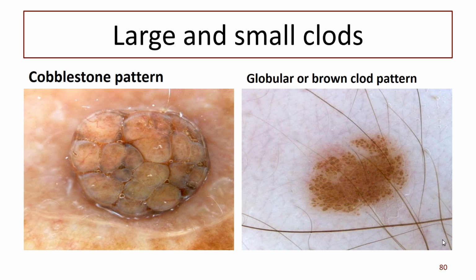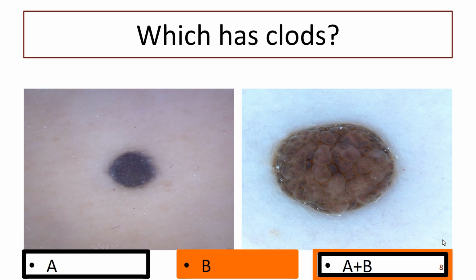And some of this pattern will turn to this pattern with age. So a child has this pattern. We don't see this very much in adults, so something must happen to it. And what we know happens is at least some of them become what we see here. They become from flat nevi to papillomatous or bumpy papules.